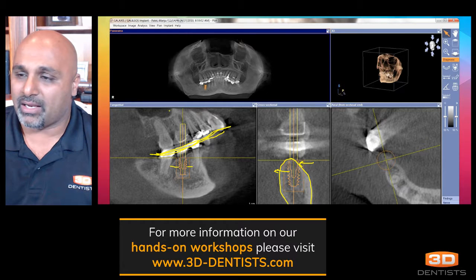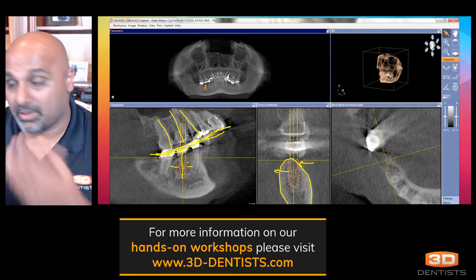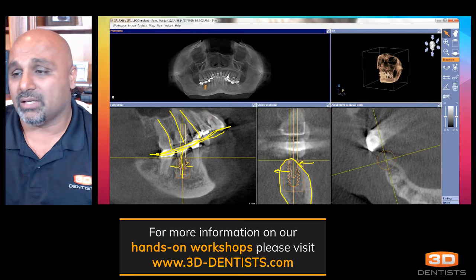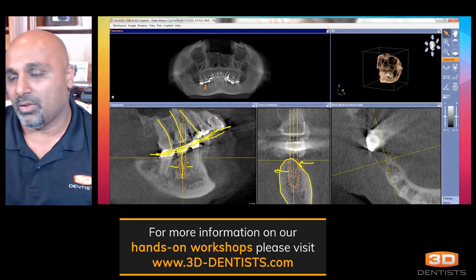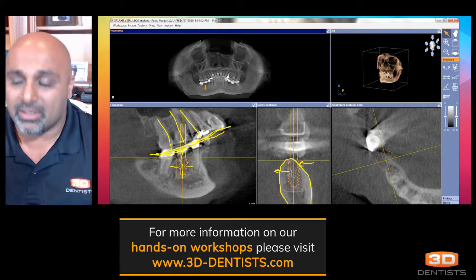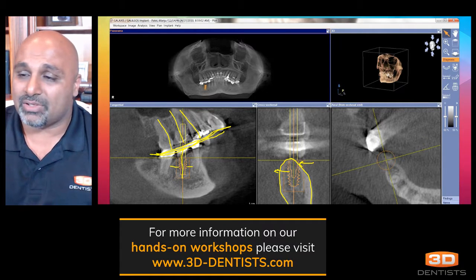And if we look at our upper teeth here, just like so, what we can see is that it's not going to hit the implant in the long axis. In fact, it's going to be hitting the implant at an angle. And the truth is this probably won't be that big of a deal, but over time, this can create an issue.